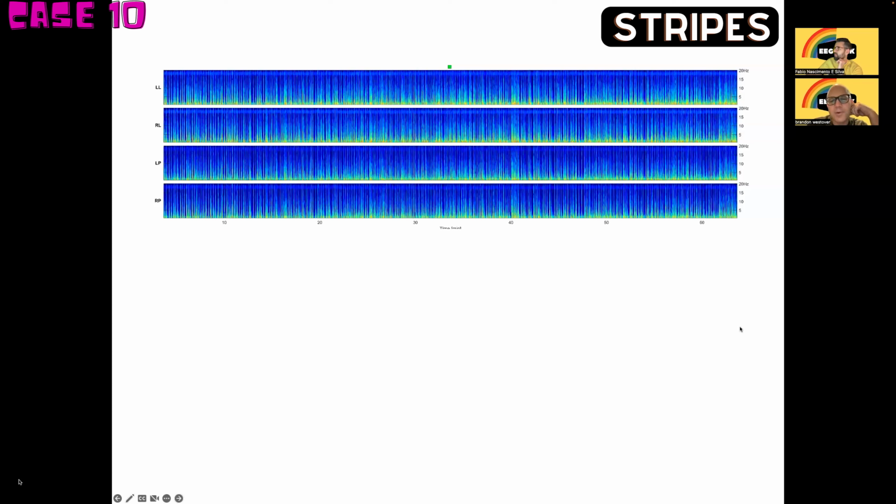Now tell me before we look, do the bursts have epileptiform activity in them or not? I don't think so. It's hard to tell at this scale. I think that they do go up above 5 hertz most of the time though. If you look, the bright, kind of yellowish part goes up. So I think these may have spiky parts.